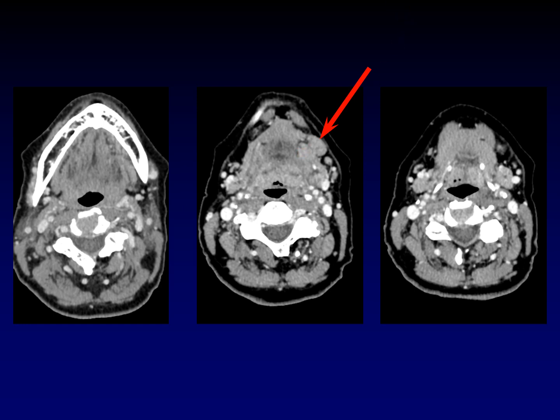The key to the diagnosis is that everything about this, all of its CT appearance, is so much like the other salivary tissue depicted on the CT, and it's also in a characteristic location on a line between the sublingual and submandibular glands. That's how you can be confident that you're dealing with ectopic salivary tissue.